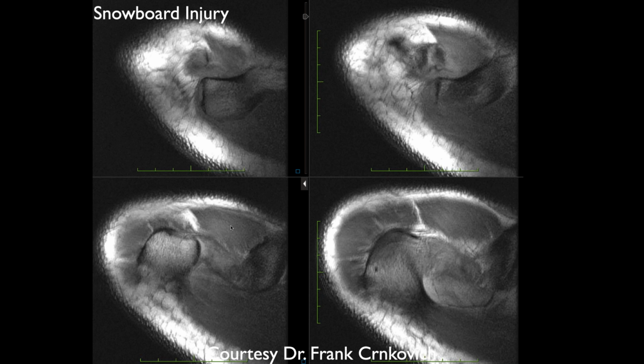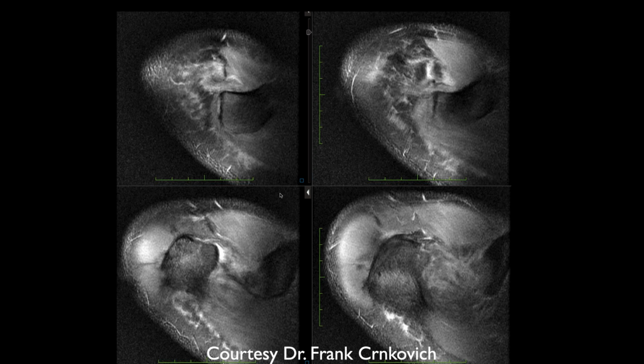On the first go, we can see the distal end of the clavicle, and we don't see the acromion. So it looks somewhat superiorly displaced, and it also looks superior and posterior displaced. It's almost like a type 4 or even type 5.